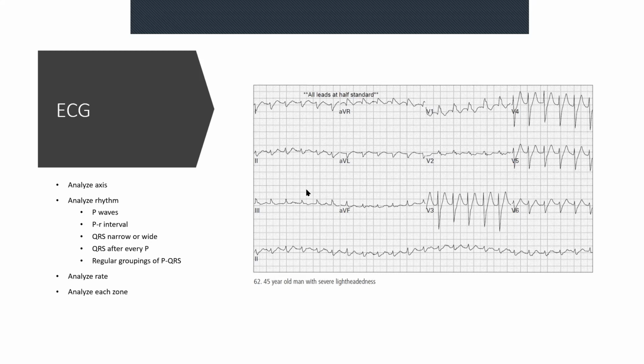Now, this is one of those that when you see it, you may get a bit scared and think, oh my God, what is this? What am I looking at? What do I do? So let's have a look at it and see. Let's analyze it bit by bit, and then we'll take it further. So let's look at everything in order. Let's do that on the next slide.